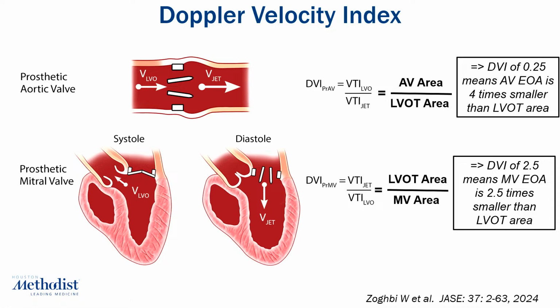And that's difficult to achieve, because the sonographer provides you with an LVOT TVI. They place the pulse wave cursor in the LVOT, and sometimes they provide only one. Then you go and measure the LVOT dimension, and it might not be at the same location. So that's very important to know and to realize, because there's a lot of hype about the DVI ratio without really looking into its details.